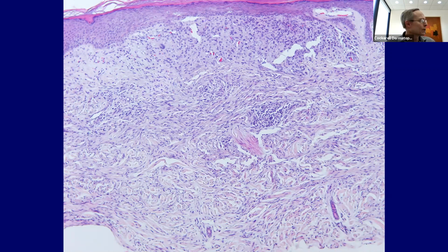But then there are some others that come up on occasion. So sometimes you need to think outside the box. The endothelial cells can sometimes be spindle in shape. Squamous cells can be spindle in shape. Fat cells, we talked about spindle cell lipoma last week, that can be spindle in shape. And then sometimes melanocytes. Again, there's 8 different sort of morphologies of melanocytes, and one of them is spindle. So spindle and epithelioid cell nevus, for example, Spitz's nevus. So that's certainly another one.